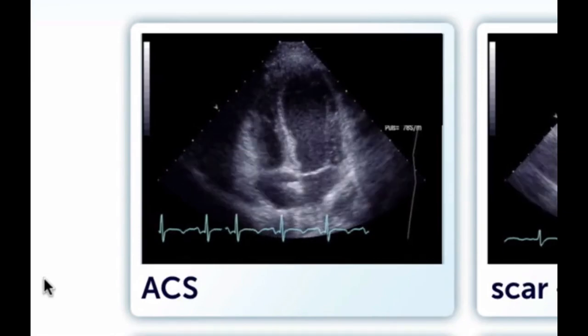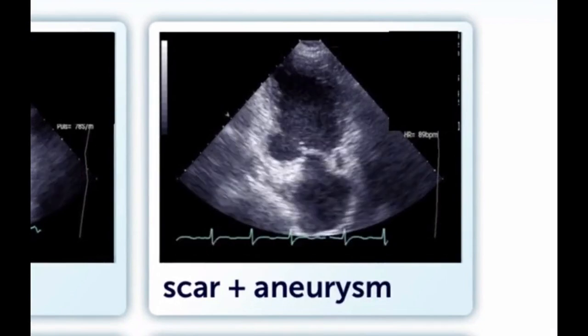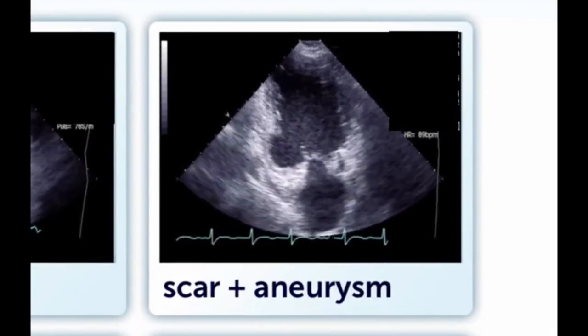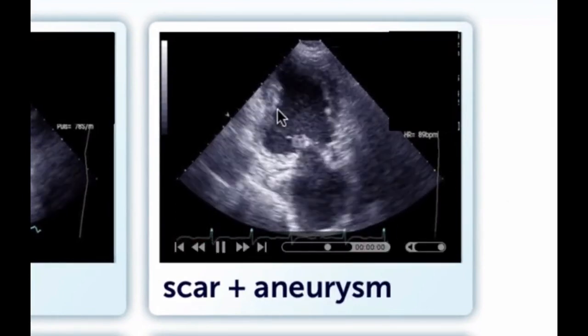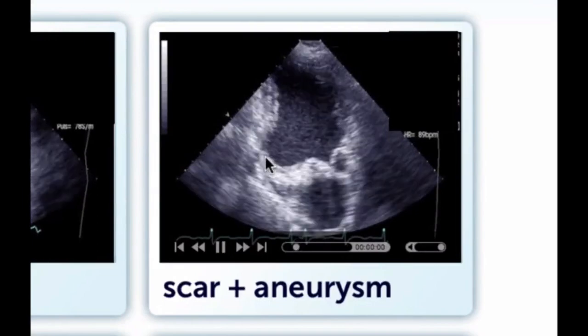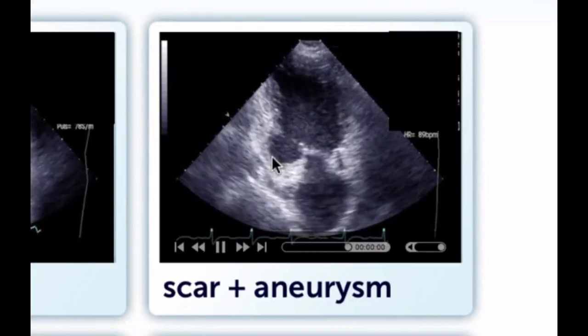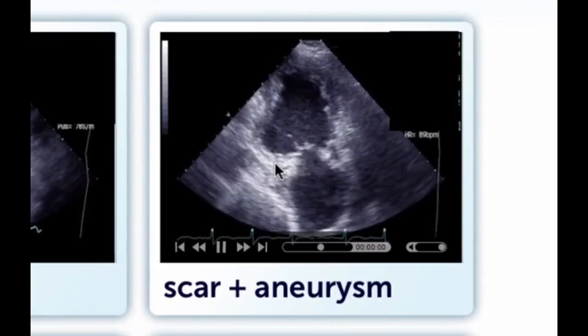was adequately treated. Here we have a patient who had a myocardial infarction many years ago, and where we know that the right coronary artery is occluded. Now, we can certainly not expect that reperfusion will bring about a normal contractile function of the segment simply because it's a scar. It's thin, it's echogenic, and it is also aneurysmatic.